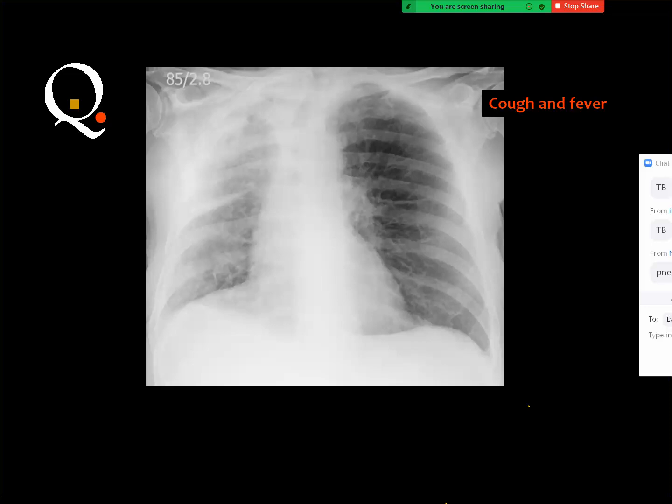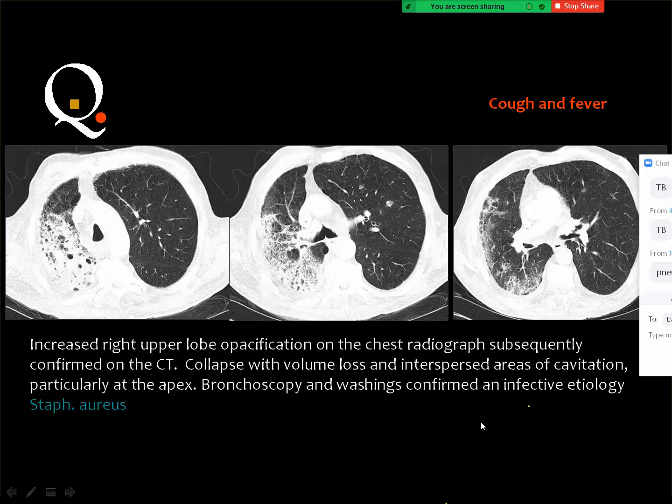Yes, and this is pneumonia. I intended to provide this case because you know that all patients are extremely oriented by COVID. And many of the cases diagnosed as COVID are not actually COVID. They are pneumonic consolidations due to any other organism.